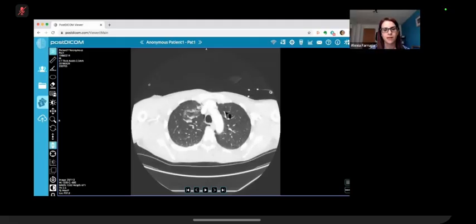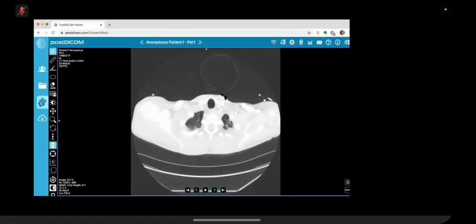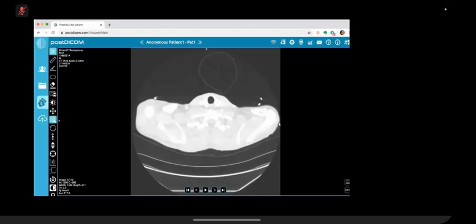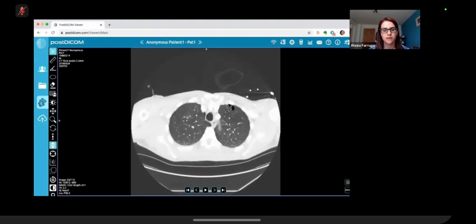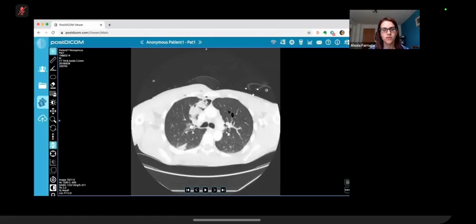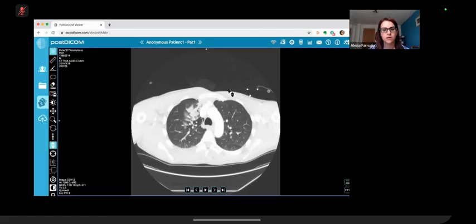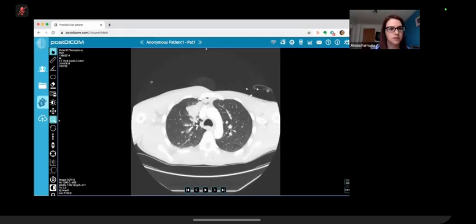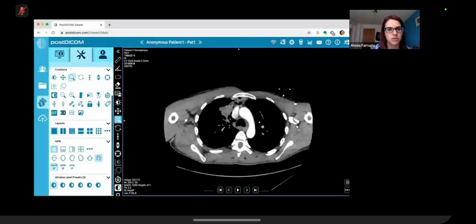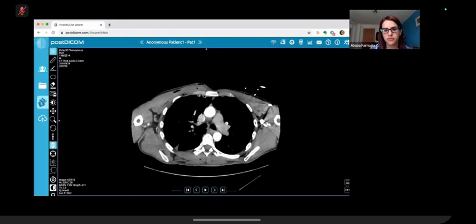So I would advise the clinical team of my findings. I'd also like to ask the team how the patient is doing. Is he stable or not at the moment? Good. And this is a contrast study, so you can look for active contrast extravasation into this area, which would signify that there is active bleeding in this area. It was not present in the scan. Okay. I'll just bring out the soft tissue window again. So this patient had a pulmonary laceration.